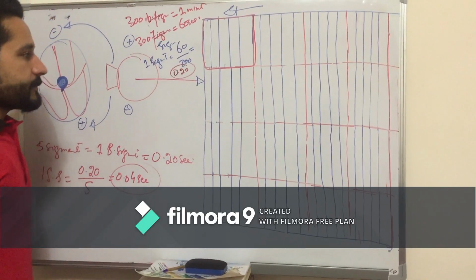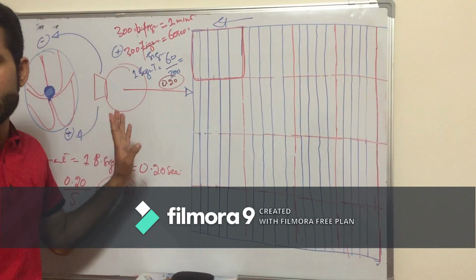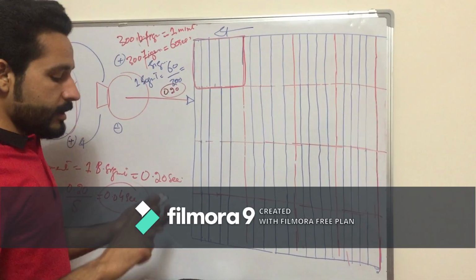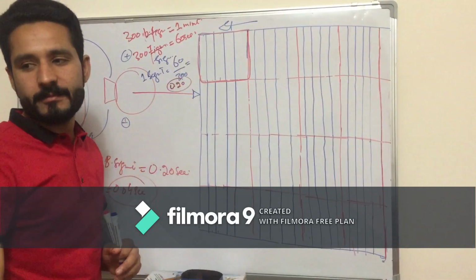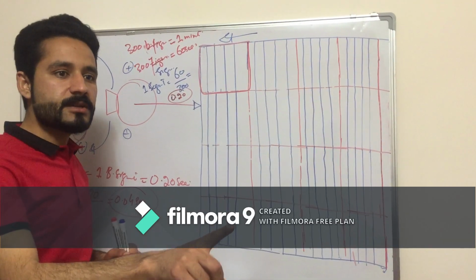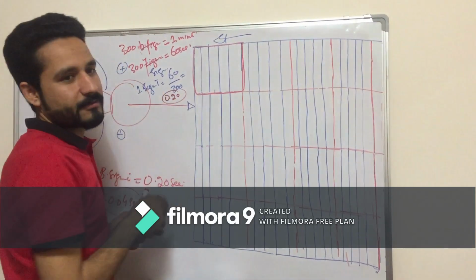Now, we will study the vectors and we will draw the same normal ECG as we have done already. Always remember 3 points. The P wave will occupy 2.5 small segments. It means this is one small segment, this is 2, this is 2.5.